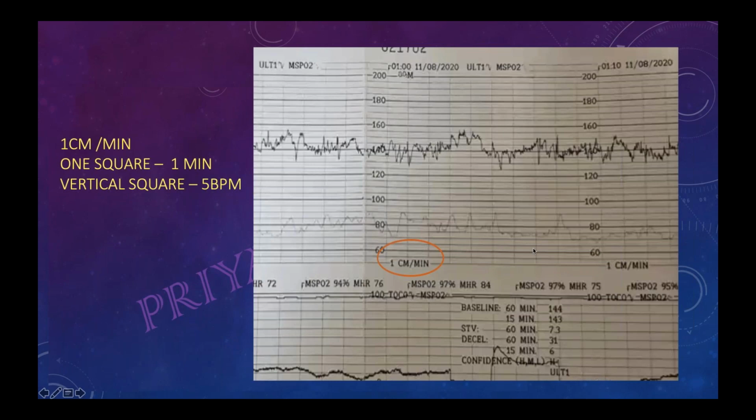In our hospital there is no recording of the maternal pulse on the CTG, but in this CTG there are two lines. One heart rate is 140, and another one is a maternal baseline heart rate of 80. I have never seen maternal pulse in a CTG before.